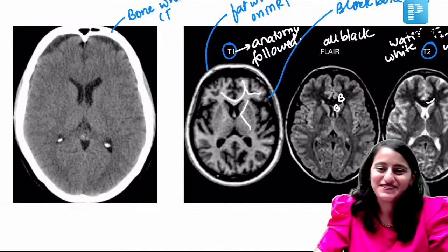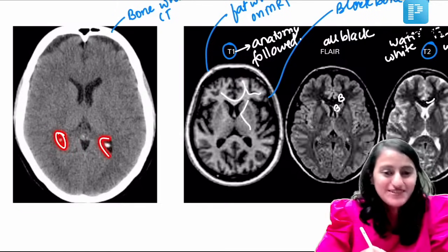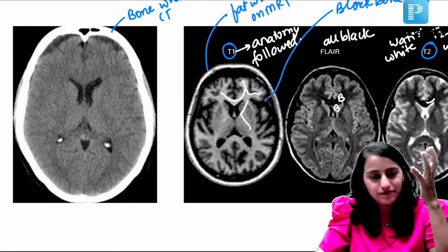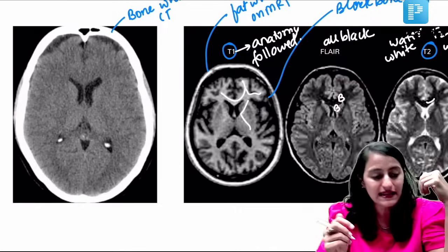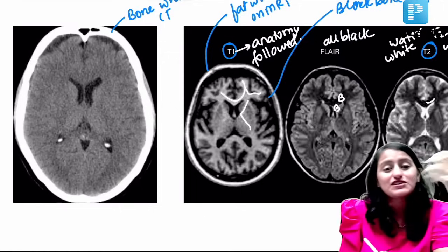So you answer it, and you ask for... sorry, before that. Very good. That is white, right? So white on CT is either calcification or acute hemorrhage. See, think logically. Now, for those who are saying pineal gland, it is a single gland. It's in the midline that you see the pineal gland. It's not a bilateral structure. So this is not pineal gland. This is calcification, but where?